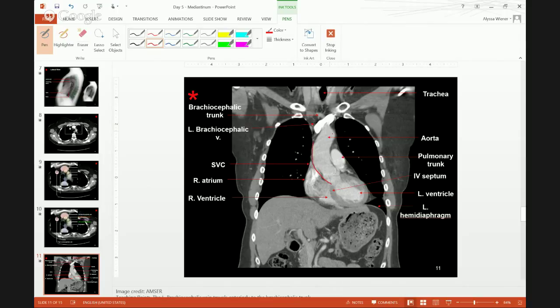Okay, then this big thing coming off the left ventricle has to be the aorta. And remember, we were just talking about the branches of the aorta. So this little guy sneaking out is the brachiocephalic trunk. And again, we see the left brachiocephalic vein here is very bright and white, which we usually associate with bone, but this just happens to be a high contrast image, and we know there are no bones floating around like this in the middle of the chest cavity because we are posterior to the sternum and all of that stuff. So this guy is not a bone. This is a left brachiocephalic vein that's running in front of everything that is branching off of the aorta. And we can see the brachiocephalic trunk sneaking out behind the left brachiocephalic vein.